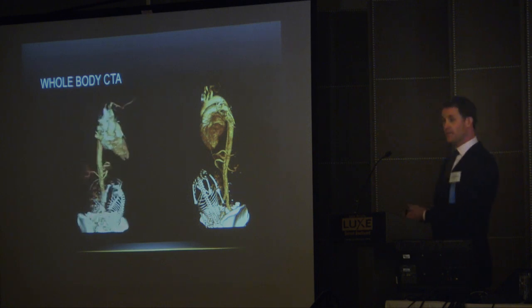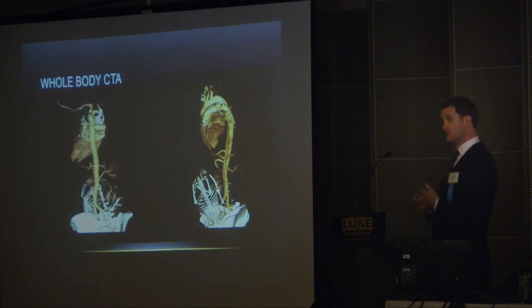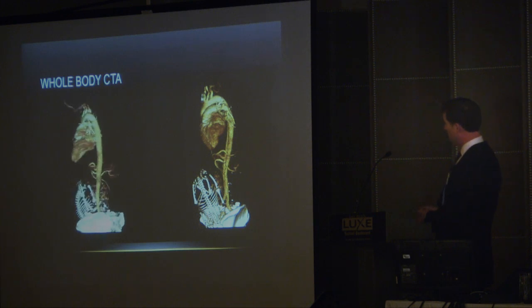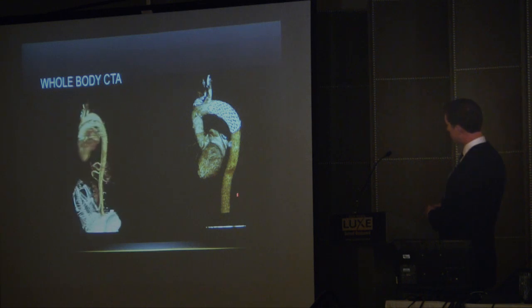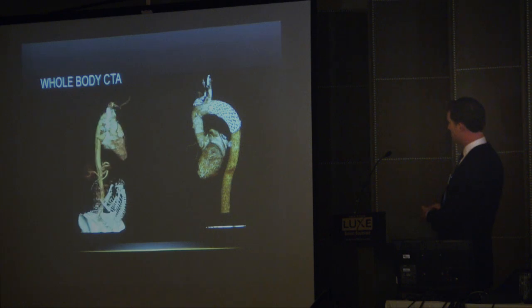This whole scan would take in the range of about 2 seconds. With someone who's this pregnant, obviously they won't be able to lie flat in an MRI scanner for very long. So this is obviously the optimal, or one of the optimal modalities for looking at this patient. She did very well after I stented her. You can see here that she has complete resolution of her dissection flap and the kid was born healthy and well.